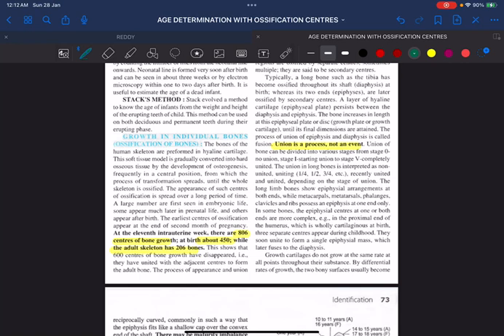Or we can say, it is not less than 12 years. Or the age is more than 16 years. I can't say whether it is 20 or 30, it is more, but it is more than 16 years. Why? Because at a particular point, the ossification centers in the bone might not have fused. But after 1 week, if you repeat the X-ray, the epiphyseal line would have fused.